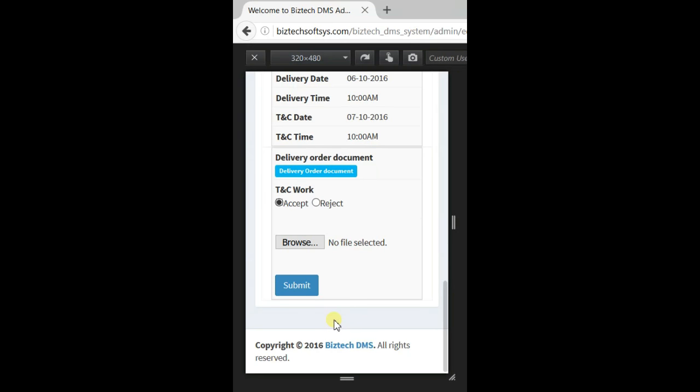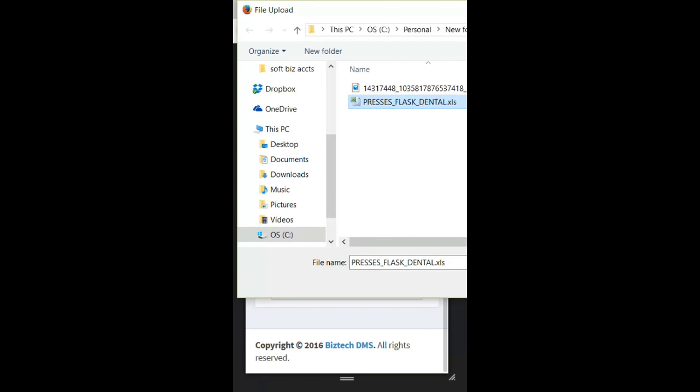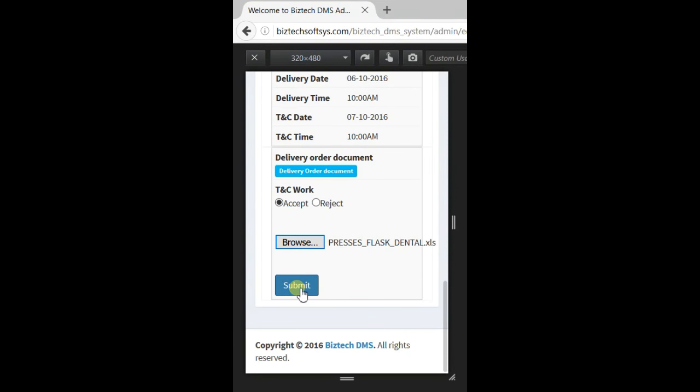And if it is on some other day, he needs to visit the clinic the next day or the following day, finish up his testing and commissioning work, take a snapshot and upload that file into this, and upload the document into the system and click submit.